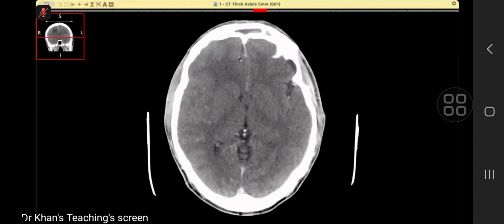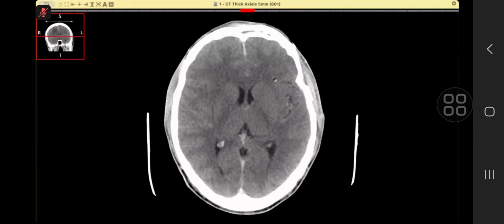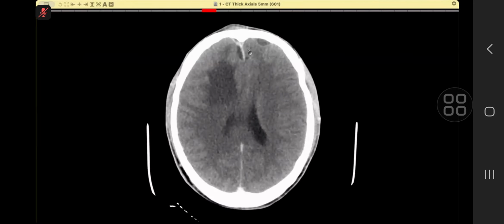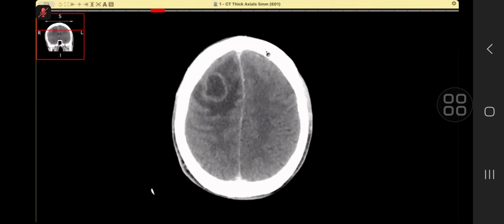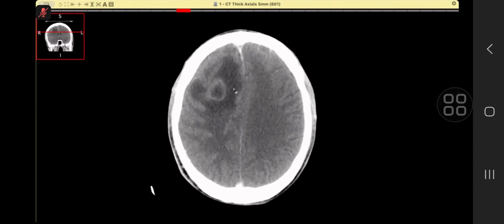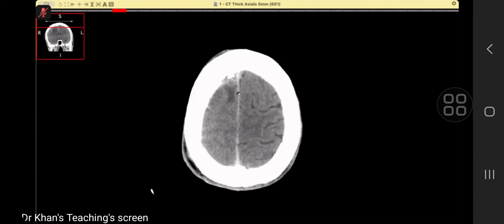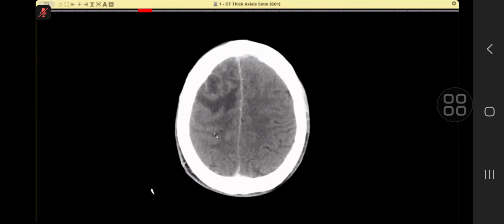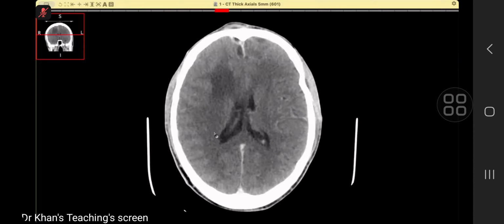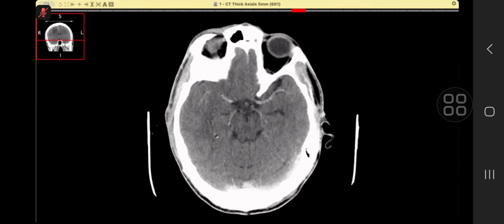So now you can see on a CT scan. Develop your eyes, forget about the burr hole. These are slightly more advanced findings, but you can see this epidural abscess here. You can see this epidural here. And this is of course parenchyma. And if we see the edema part, you remember what I was showing you on the FLAIR sequence. Look at these sulci, look how they are effaced, and you see this enhancement. So there is a bit of leptomeningeal enhancement also. So this is a good case, a classical exam case.